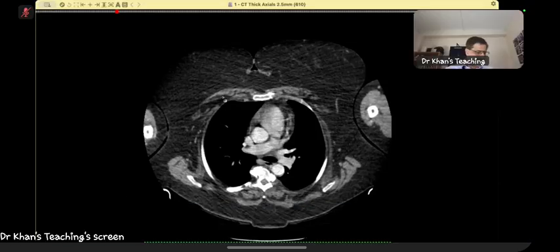Female, 79 years old. She has dysphagia and weight loss. Patient cannot cooperate. They tried an OGD, could not do it. Now, because of the time factor, I just want you to look at the esophagus.